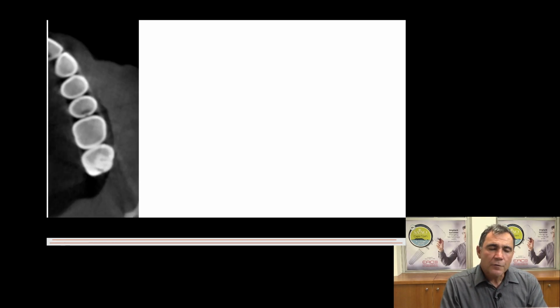The next is for the general practitioner, more work. Caries is very easy to detect. It's one of the easiest things if you do not have artifactual problems. And I see it a lot in impacted canine cases where I find carious lesions, and I can then take a picture like this and send it to the dentist.